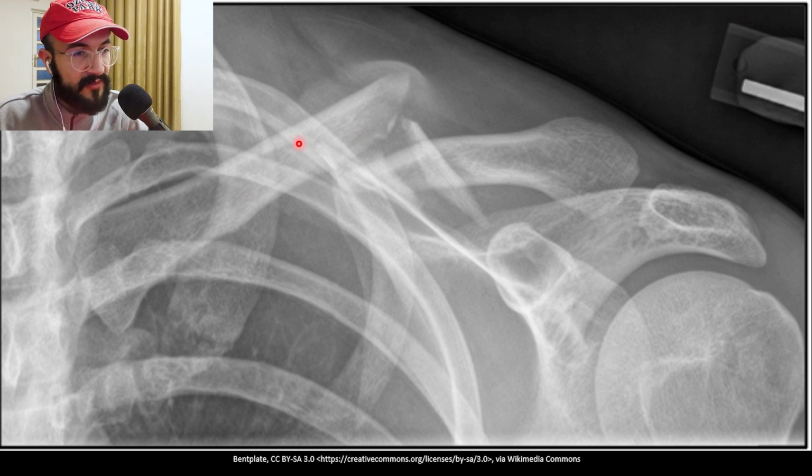And we move on to the end of the clavicle, and we can see that it is normal. And then we assess the scapula. We have the glenoid here. It looks normal. The coracoid, the spine of the scapula, the acromion, and the rest of the scapula have no fractures. And then comes step 2, which is assessment of the joints.